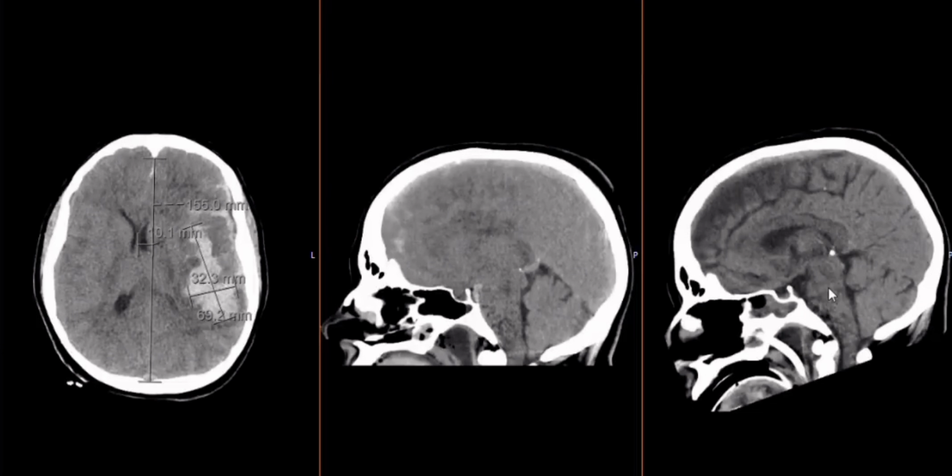If you don't protect your airway, well, that's a bigger problem. Yeah, but you can see an endotracheal tube here, so airway protected with an endotracheal tube. And so, yeah, if you squash that for long enough, you'll infarct the pons. There's not much recovering from that if it's dead enough. Cool. Ready.